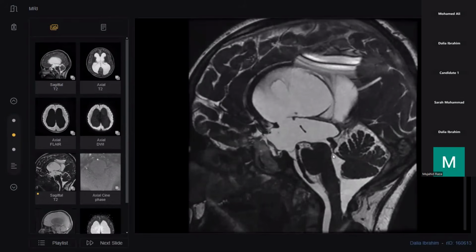Okay, so how can we describe what happened to this girl? She had a previous recurrent history of meningitis with some sort of fibrosis and adhesions, and those adhesions, as we can see here, those are fibrotic bands or webs, obstructed the distal part of the aqueduct of Sylvius, leading to this marked supratentorial ventricular system dilatation.